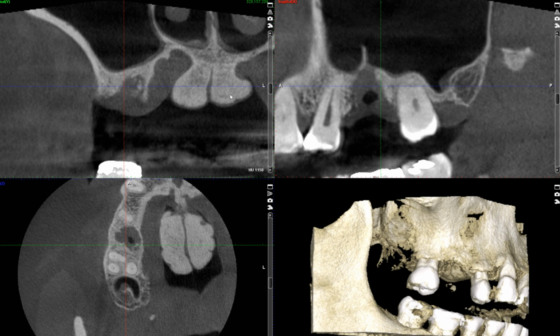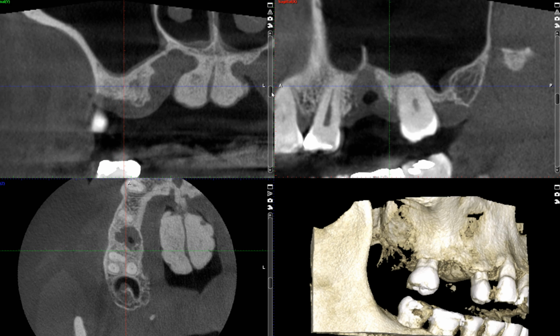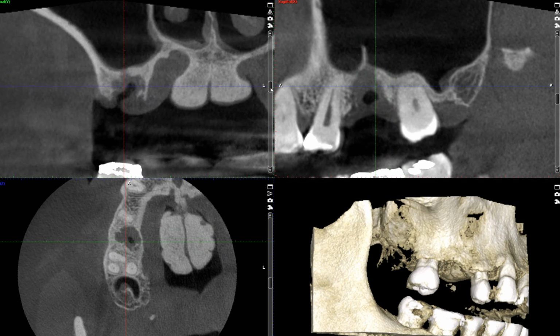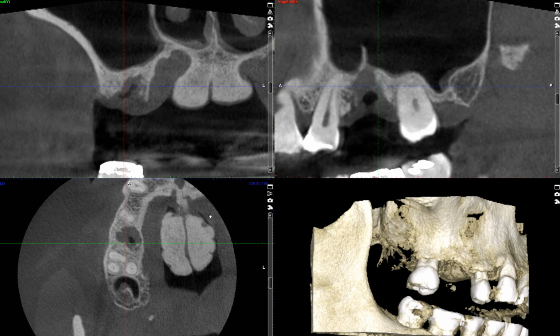It has very similar density to that of cortical bone. It doesn't have a whole lot of trabecular bone in this particular case. Not only that, it has two halves that are meeting at the mid-palatal suture, or intermaxillary suture. And yep, that's what we have here.